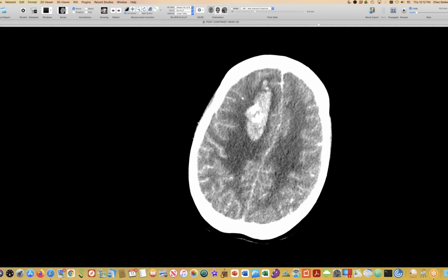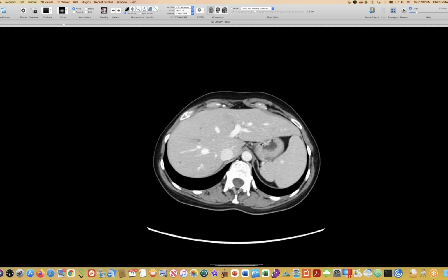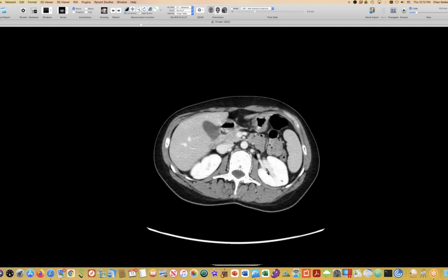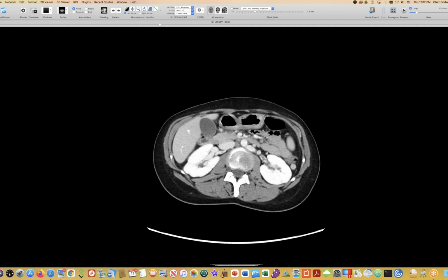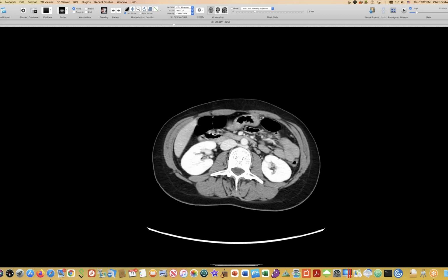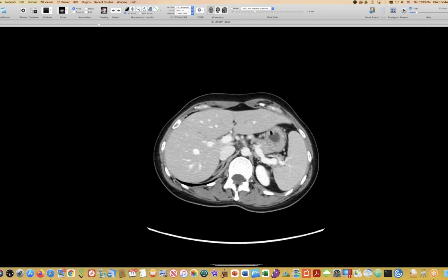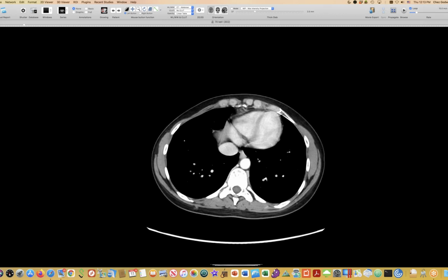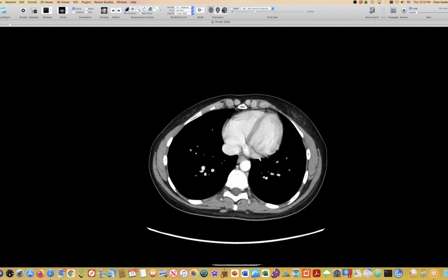And then in her abdomen, she has some renal vein thrombosis here on the left. And I think this is maybe an ovarian vein or something going down. I don't think that's ureter going down, but that also has thrombus. And there were other mesenteric thrombi in this woman who died. So care to guess the context of what all of this is? I'm sorry, it's not really a chest case.